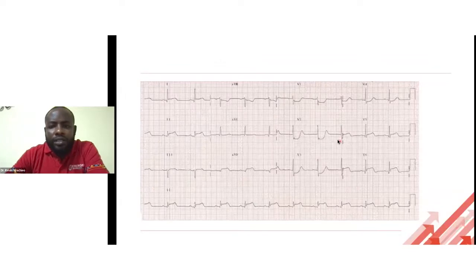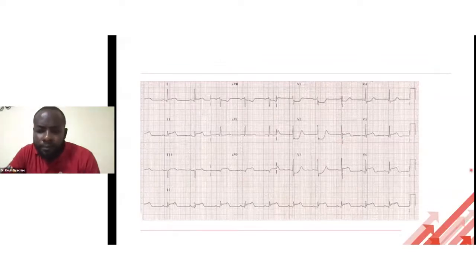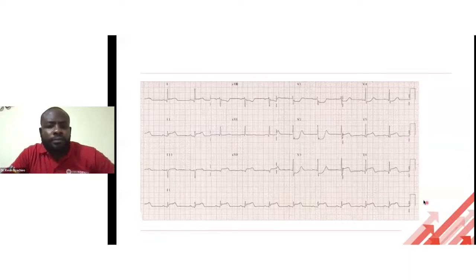What are you guys seeing here? Same patient, 50-year-old gentleman, diabetic, hypertensive, coming with chest pain, and then you put an ECG and you're looking at this. So what are you guys seeing here?